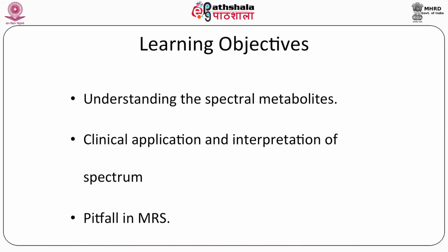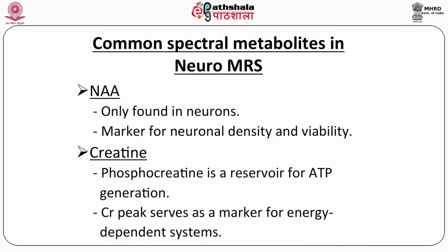Objectives: understanding the spectral metabolites, clinical application and interpretation of the spectrum, pitfalls in MRS. The common spectral metabolites in neuro-MRS. Metabolic information obtained by MRS can be helpful in diagnosis.